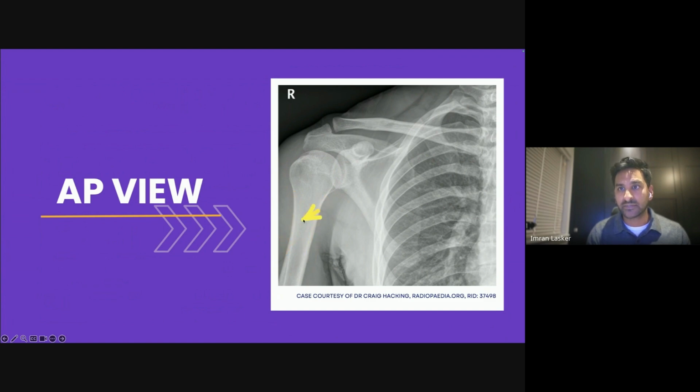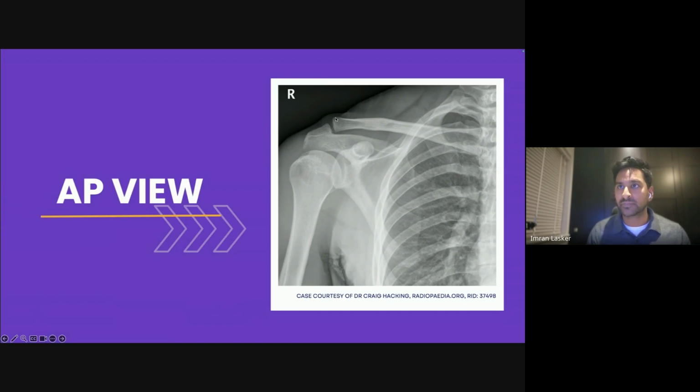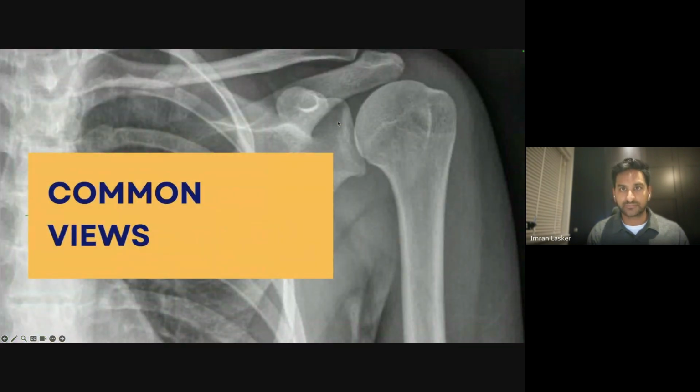If you find any dips or anything like that, then you've got to start worrying there could be some kind of fracture. Obviously, fractures can be very, very subtle, and so you have to try and attune yourself with what a fracture actually looks like, and I will go through that as we go through the rest of this talk. But one thing I want to draw your attention to is when you look at the edges of any bones, right? So when you look at the edge of the bone, you can see that, oops, sorry, let's go back again.